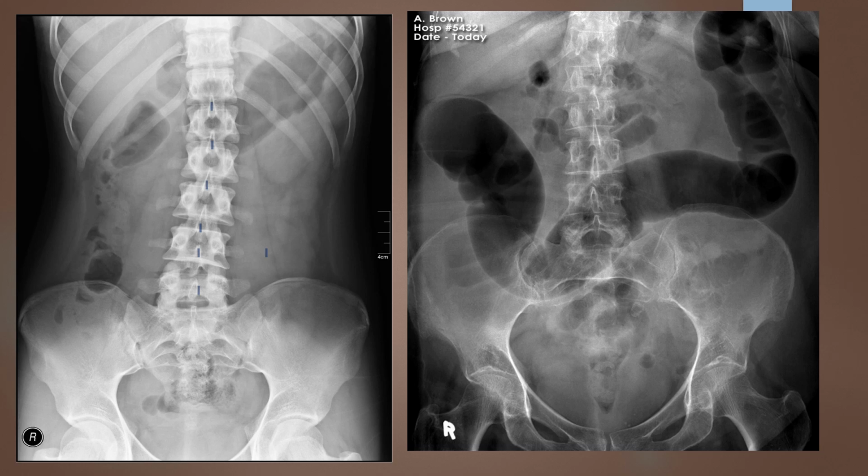So what I see here is that I have spinous processes centered down here, I have spinous processes centered down here, and I have a big curve in the middle. This would indicate that this is probably a scoliosis patient. So I think my mid-coronal plane looks good according to the spinous processes in the vertebra. If I come over here and I look, I can see that I have pretty equidistant between my SI joint and my lateral iliac on both sides. Both iliacs look relatively open. I don't notice a significant difference in size.